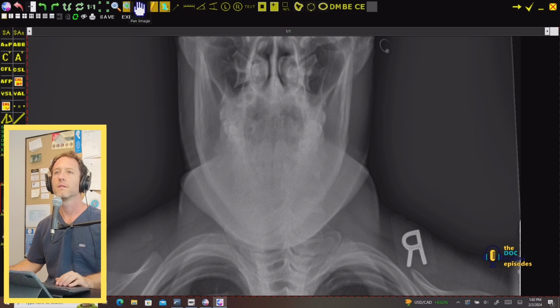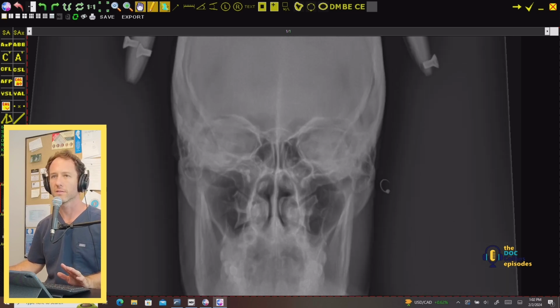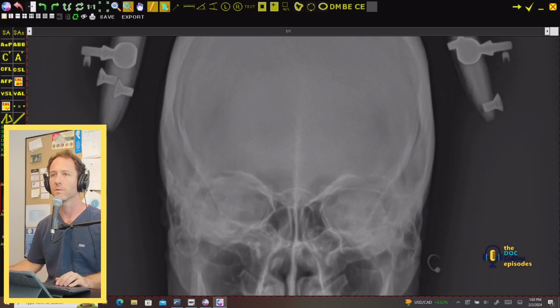But we'll just do a frontal x-ray and exclude condylar aberrancy, which is the asymmetric height of one condyle to another, maybe for a future video. But just have a quick clip of how somebody who practices AdvO might do their films, in case you were curious.